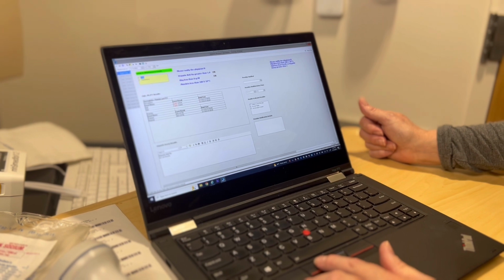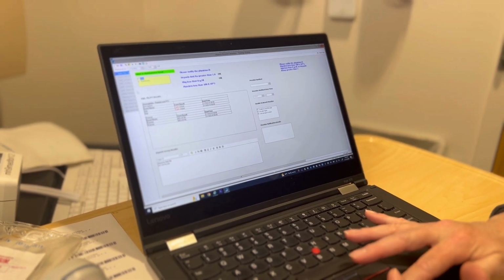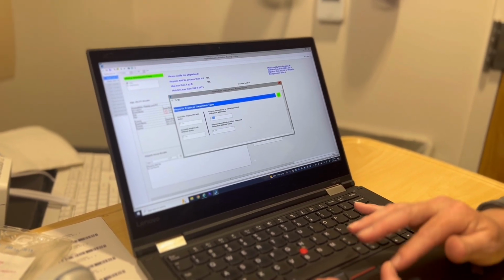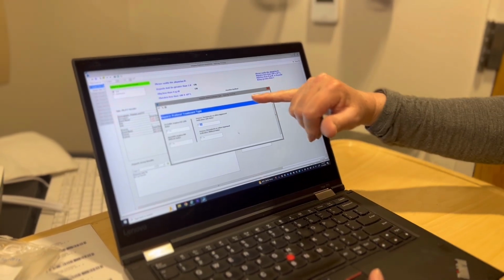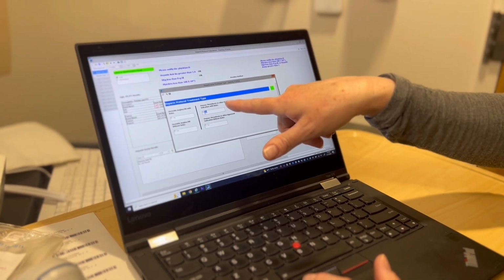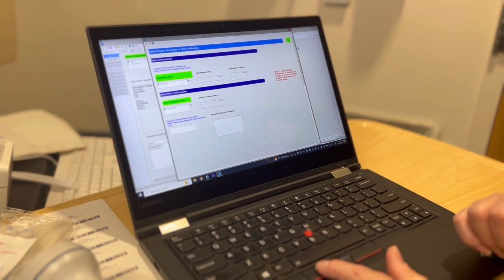This is the first screen that comes up, and it is going to ask you initial or maintenance event. If you're initiating it, obviously it is the initial. If you are changing it because we've gotten assays back, it'll be maintenance. So we are initiating this, so it's initial. It's then going to ask, is this for unstable angina and MI or is it for VTE? Our order said VTE, so I'm going to click yes. It also asks, is it with a bolus or without a bolus? That's why you need to have looked to make sure you know whether it is with bolus or not. Our order says with bolus.